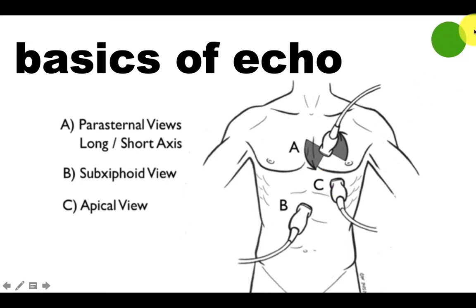One other thing, just pay attention to where the indicator is on your screen. Here at UW, we've agreed to be in line with cardiology, so the indicator is always pointed towards the right side of the screen for any sort of cardiac exam. And I'm going to teach this lecture assuming that the indicator is on the right side of the screen. If you find that it's flipped on you, you may just need to change the exam type and go back into the cardiac setting.